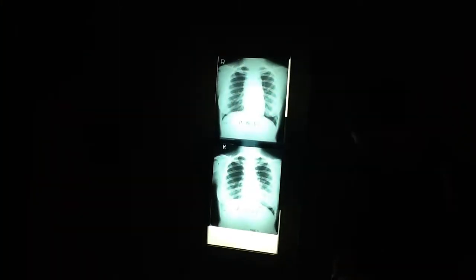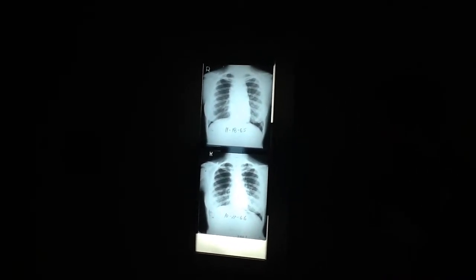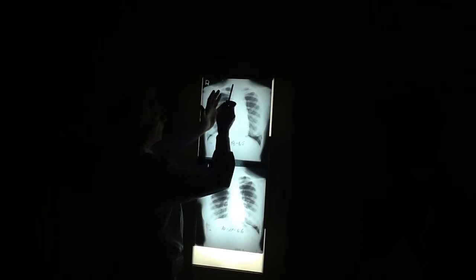This was the third one in our neoplasm group, wasn't it, for cavitation. Look at the mediastinum firstly. Look at the mediastinum. This is not a normal mediastinal configuration, is it? What is the mediastinum doing? Because look at it on this one.